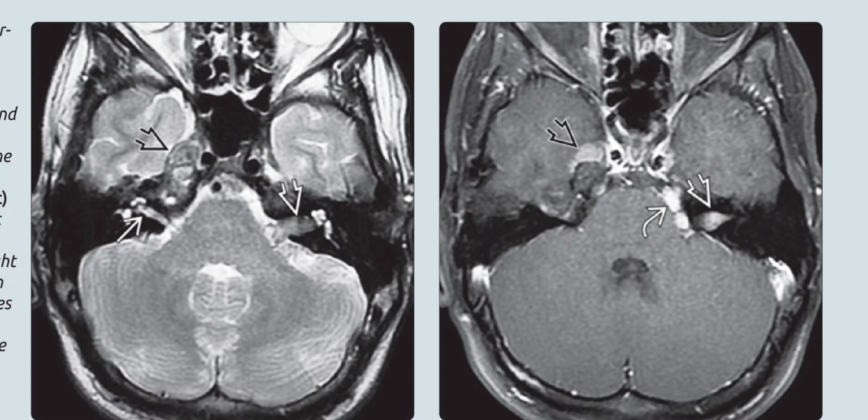The right image is the T1 contrast-enhanced fat-suppressed MRI sequence in the same patient, and it shows the left internal auditory canal mass, which is enhancing, as does the right cavernous sinus lesion. In addition, enhancing nodules are seen along the cisternal left trigeminal nerve, and the patient was subsequently diagnosed with NF2.